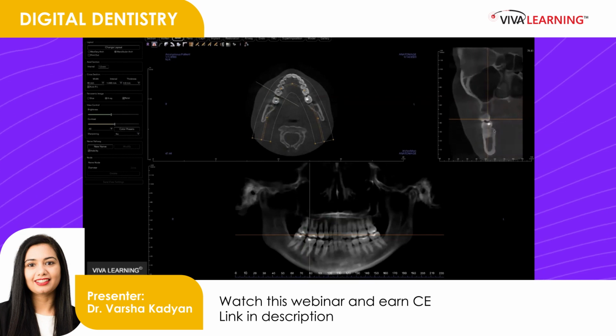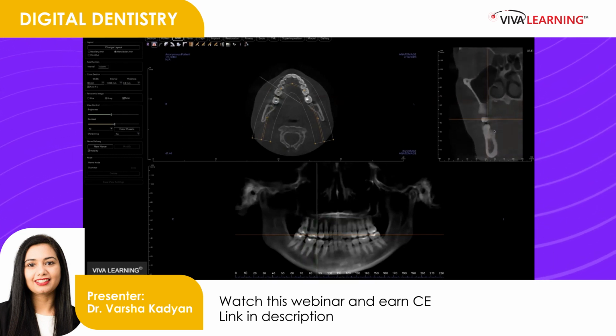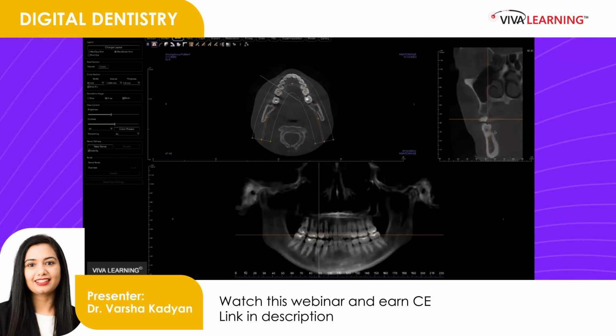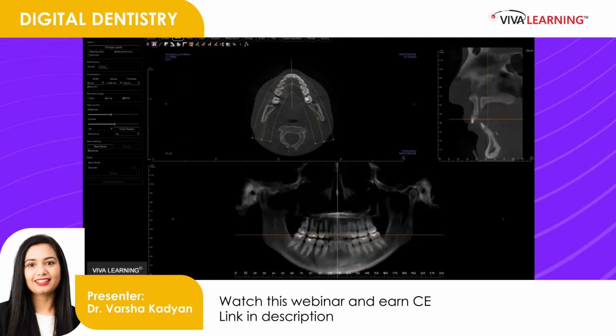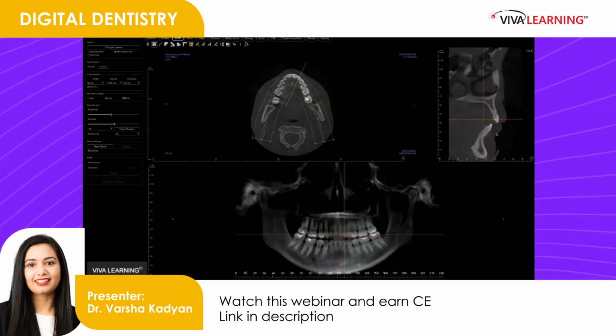As you scroll further, you can review all your dentition in the dentoalveolar area to rule out any apical pathology, or just to make sure the health of individual dentition looks fine. And again, this is the nasopalatine duct canal.